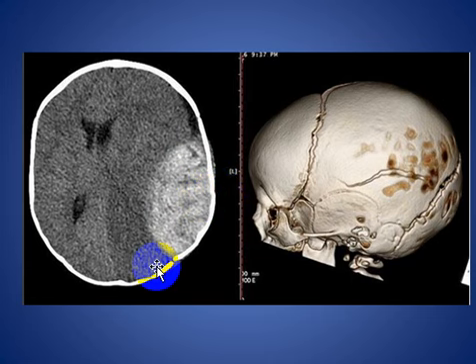The epidural hematoma is surrounded by hypodense edema and is causing compression of the left lateral ventricle, crossing the midline with midline shift, and this should be evacuated urgently.